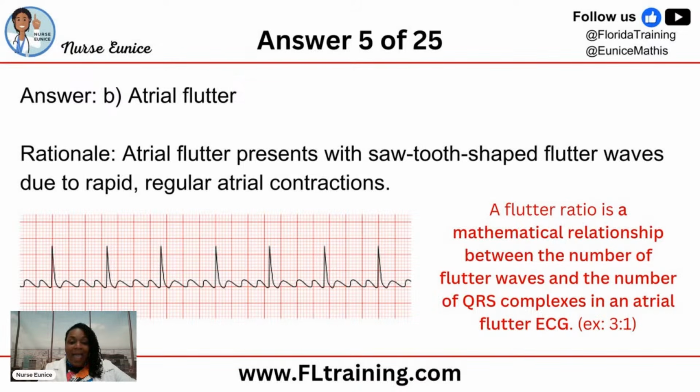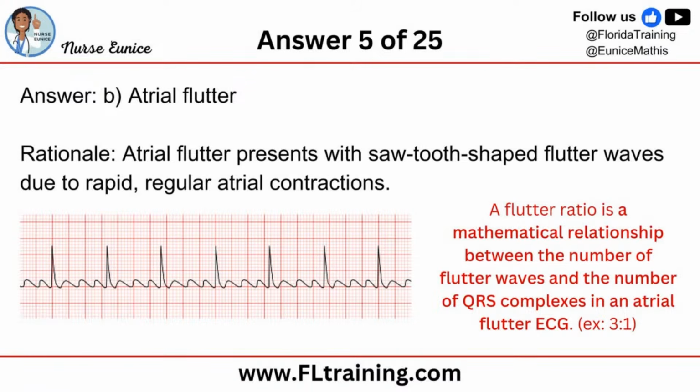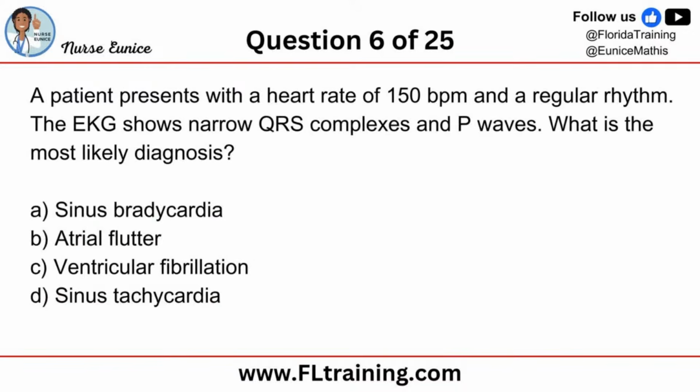How is your patient presenting? Your patient's probably fine. Because if we go ahead and we count it out, their heart rate is 70 beats per minute. So in most instances, this would be something that we monitor, that we notify the doctor of, that we will probably do blood pressures about every hour on this patient. But this patient still has a perfusing rhythm. Even though it's not perfect, we will take what we can get until the cardiologist can come in and see this patient. So atrial flutter is usually benign and it's not a medical emergency.